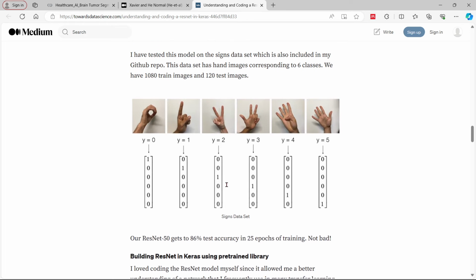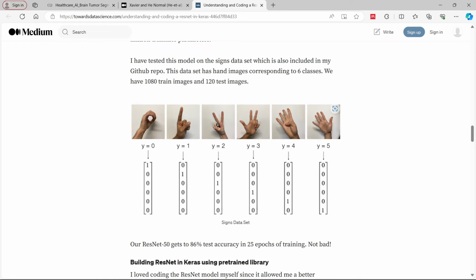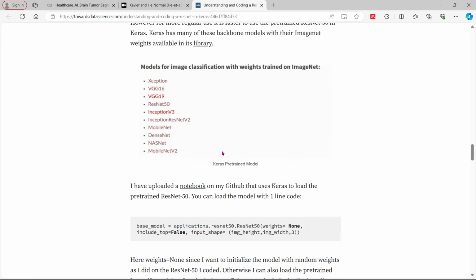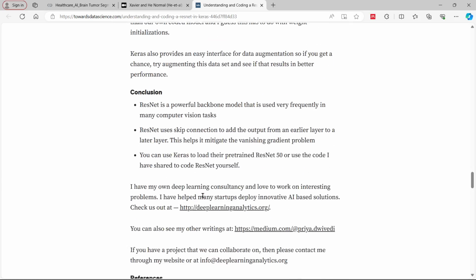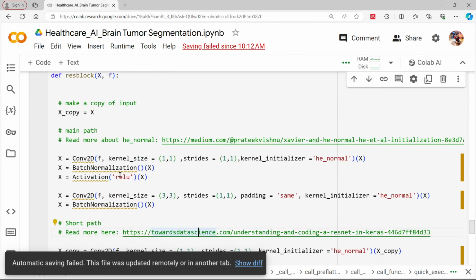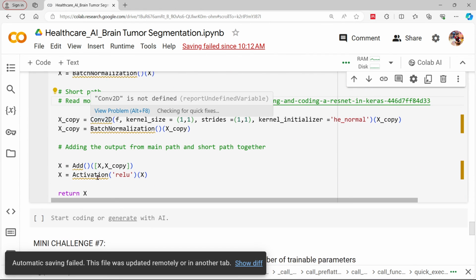I'm going to skip over this one. Here they have shown the classification of different portions. For example, we have the class for this one, the image belonging to this sign symbol. We have images for 1, 2, 3, 4, 5 and so on. Can you see the respective binary numbers? They are enabled in the same context. Now we have the notebook for the same, so all the code is inbuilt into the same notebook here.